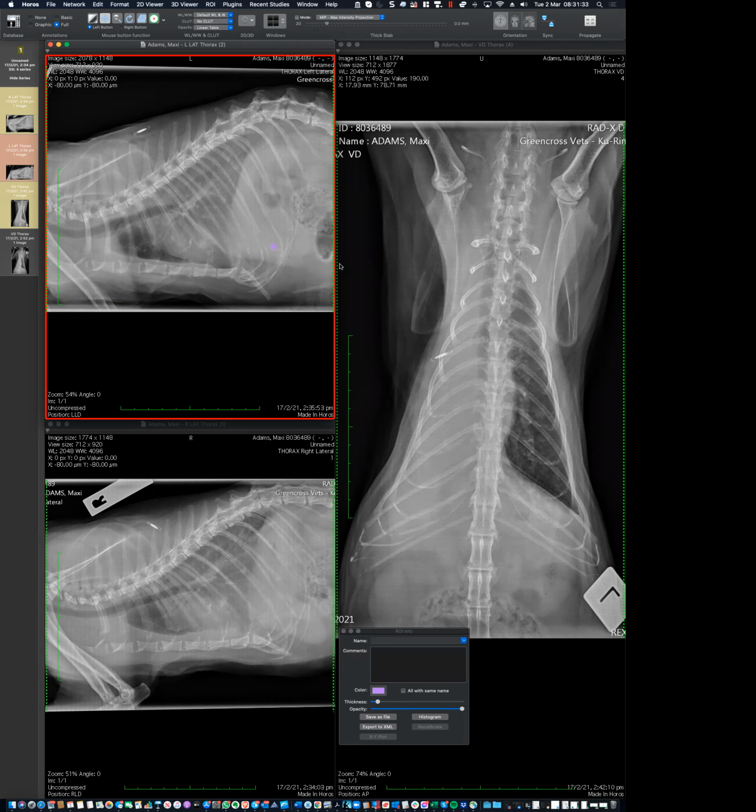Well, is there any other disease process that can result in the whole right lobes looking white? You've got chylothorax or hemothorax or a neoplastic effusion or an infectious inflammatory effusion. Is that where you're going with all this? Well, those are good options, but those options are going to be pleural effusion. Those are going to be diseases that result in first pleural effusion and then atelectasis, which is perfectly fine. I think we should consider them.